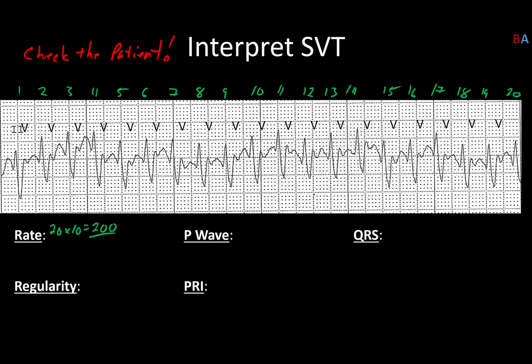So rated 200. Very tacky. And no ectopy.